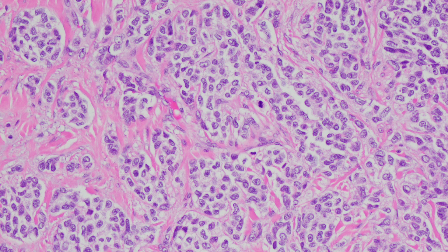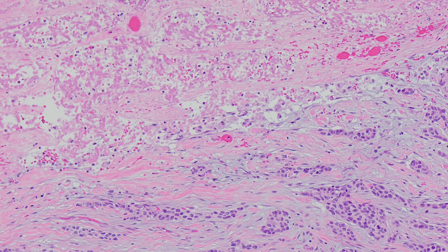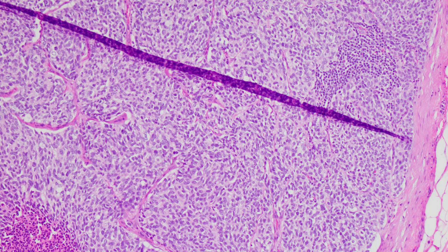In salivary gland pathology, identifying whether a tumor has one versus two cell populations is a key step in narrowing the differential diagnosis. Focal duct formation is present, an important diagnostic clue in salivary gland neoplasms. Again, only one cell population is seen. Areas of necrosis are also identified, suggesting a high-grade neoplasm. Multiple cervical lymph nodes are positive for metastasis, showing sheets of similar epithelial cells.